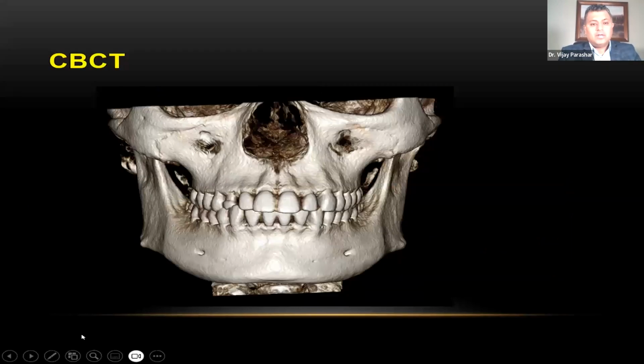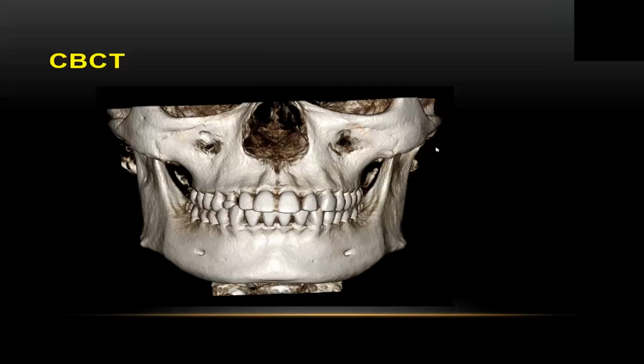Okay, let's quickly look at some more screens showing us different views.